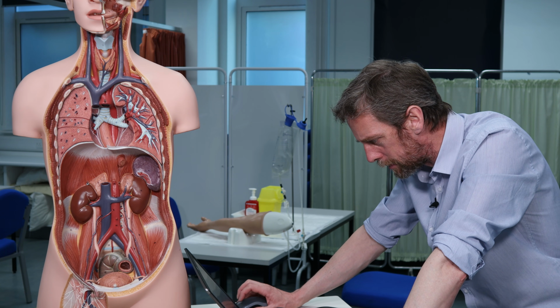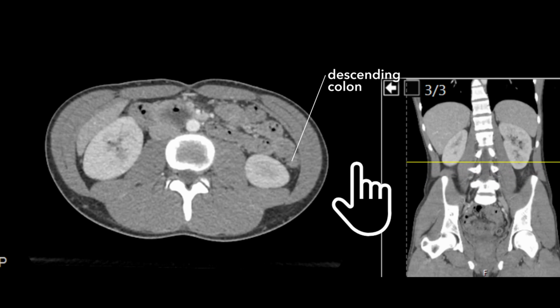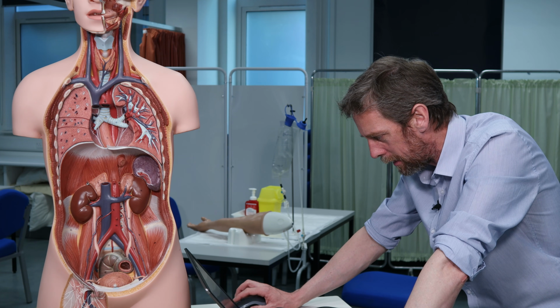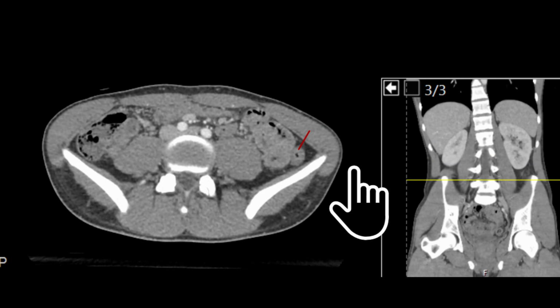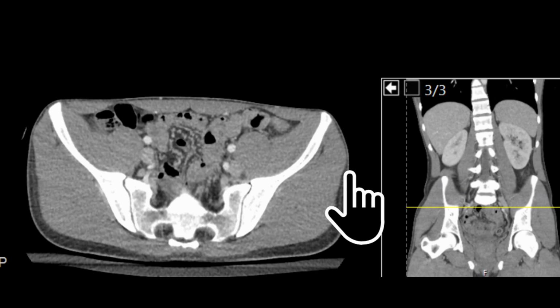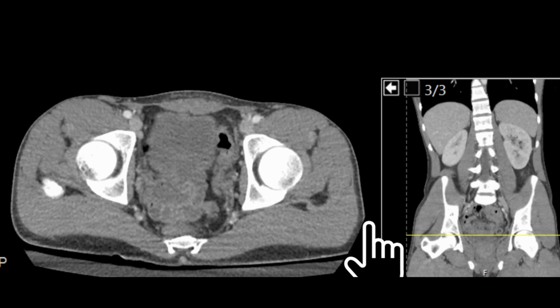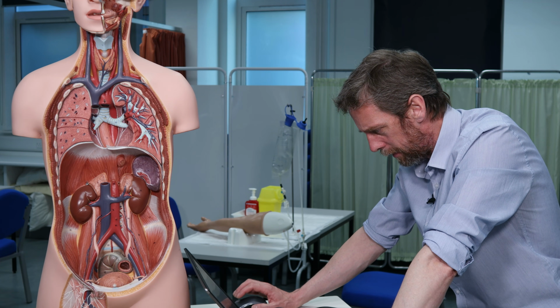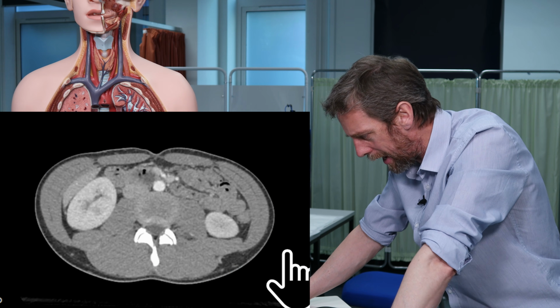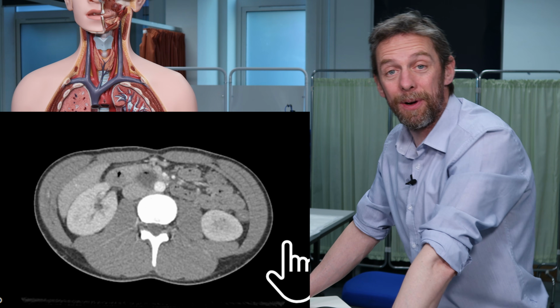scrolling down into the pelvis, back up again. So the cecum, and then on the left side, there we go, we'd expect to see the descending colon, which, I've gone too high, as we descend, going down, will become the sigmoid colon, and come back towards the midline as the rectum. But we'll do the pelvis another day, right? So, cecum's good, large intestine, which means that, really, everything else is the small intestine.